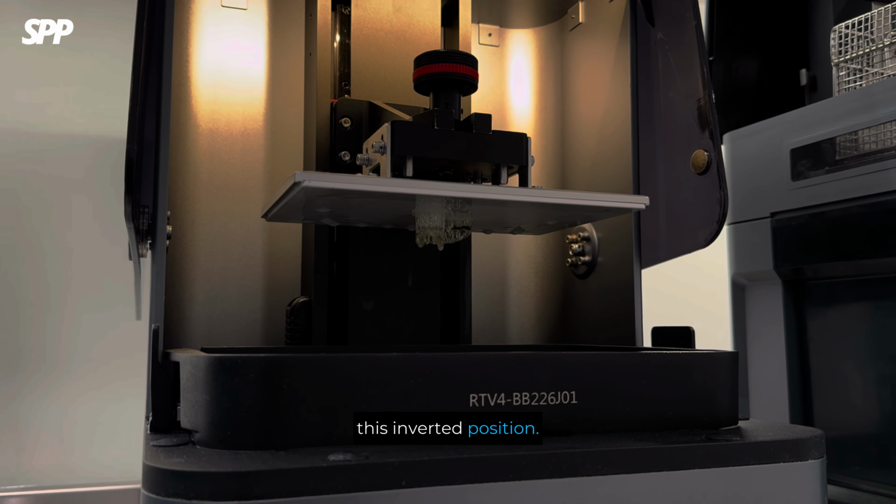The second tool is the stopper trimmer. This tool helps the drill stopper seat properly into the guide stopper. I insert the stopper trimmer into the drill hole and trim the stopper area by rotating it about 5 times. You will be able to see material being trimmed away. There is no need to overdo it. A light trim with about 5 rotations is enough.